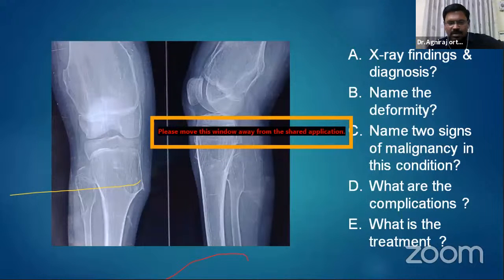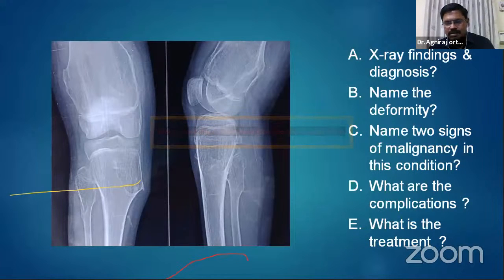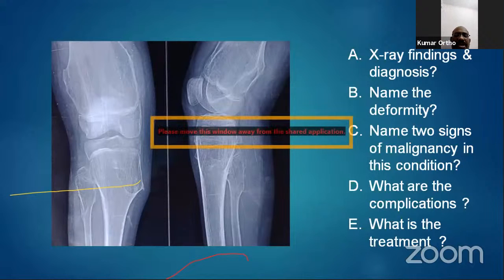What are the theories of osteochondroma? Recurrence. Recurrence will reduce with extra periosteal excision. Sir, Kumar sir, you want to ask? What is the basic defect in this? What is the cause for the trumpet shape? Here, where is the defect? The defect is the metaphyseal remodeling defect. Okay, wow. One of the causes for the trumpet shape is metaphyseal remodeling defect in multiple hereditary exostosis.